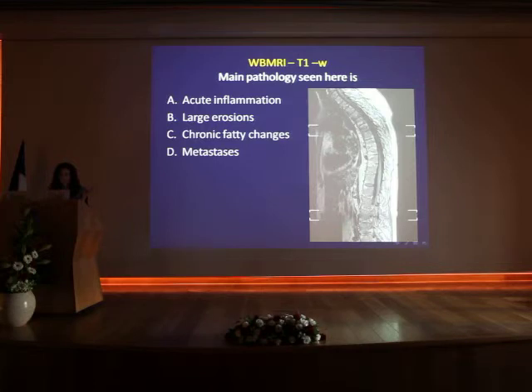And here, for example, this is also the same process but occurring around the disc, and these changes are called, on the X-rays, in the anterior part, Romanus lesions, and on the disc side they will be called Andersson lesions.